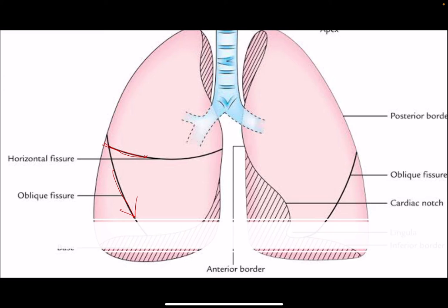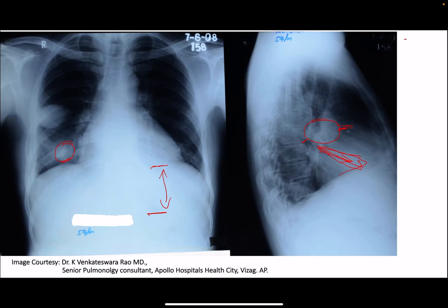So whenever, in heart failure patients, usually in left heart failure patients, when the pulmonary venous pressure is raised, whenever there is an overload, there will be formation of a pleural effusion. And yesterday someone was asking me about there being not much evidence of cephalization. There need not be, but in this case the pleural effusion is maybe clearly missed, because the costophrenic angle actually appears somewhat sharp only. Someone may think these are some malignant tumors or metastasis.